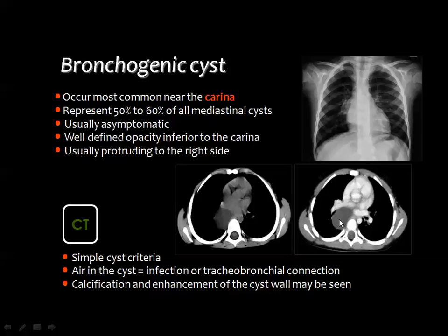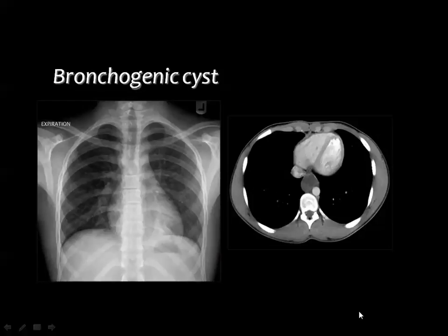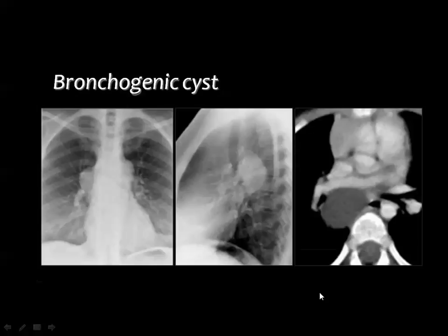And this is the pre-contrast scan showing a cystic lesion at the level of the tracheal bifurcation, and you see the clear water density, no enhancement, no calcium, no internal septations, and this part of the cyst insinuating itself inside the mediastinum is the clue for diagnosis of this lesion to be of mediastinal origin. And this cyst is totally located within the mediastinum, midline in location related to the descending aorta and the inferior vena cava, and this is a bronchogenic cyst.